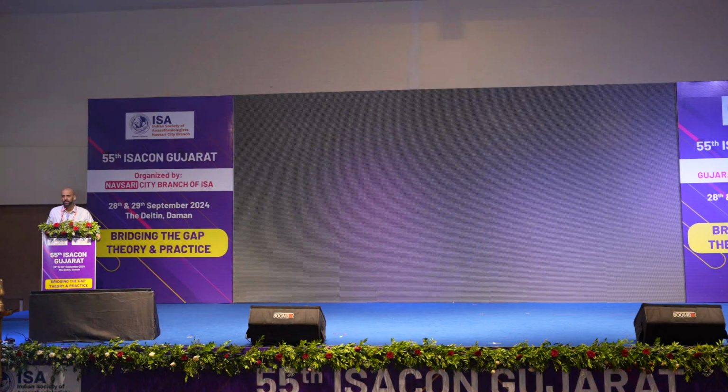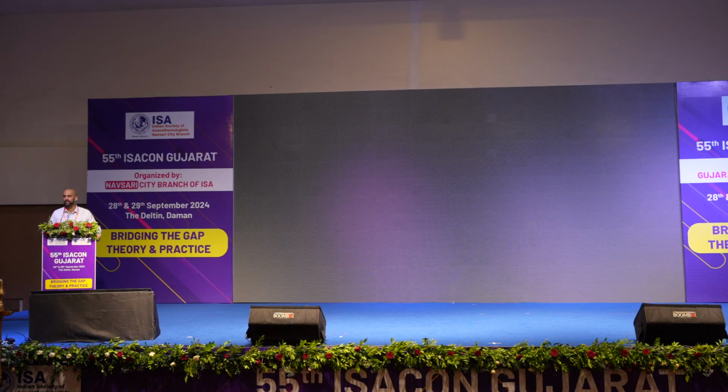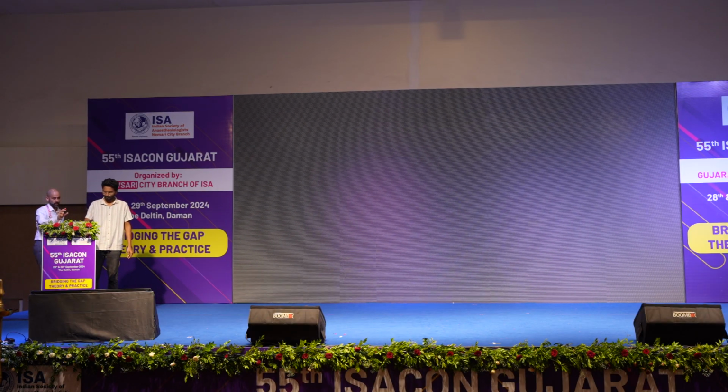This is on the ventilator. Two years ago when I presented a similar topic in Rajkot, thanks to you all, I got to meet the same friends after a while. At that time I had shared a template on how to look at ventilator modes. And what we are seeing now is sort of a follow-up from that talk.